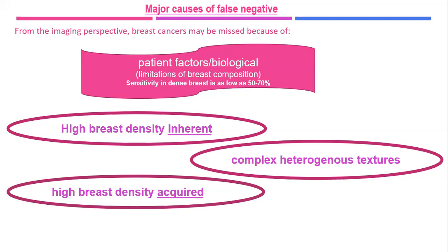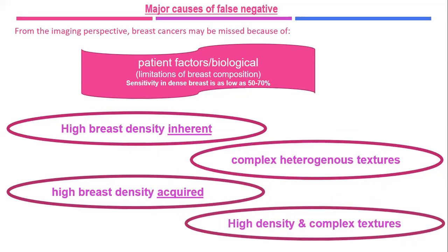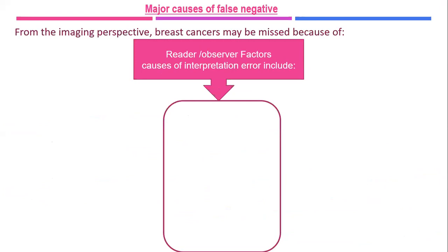Sometimes even ACR-B with coarse, complex texture can reduce the study sensitivity and hide small breast lesions. And it will be aggravated and can hide more or larger lesions when it is associated with high breast density.